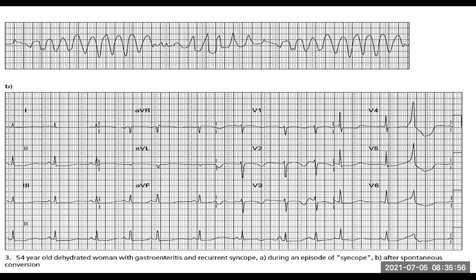Then we come to the anterior leads. The anterior leads are V3 and V4. They look at the anterior aspect of the heart. So what do we notice over there? Again, just this long QT interval. Very long QT interval that's going on. And here in V4, we see this odd beat that's taking place.